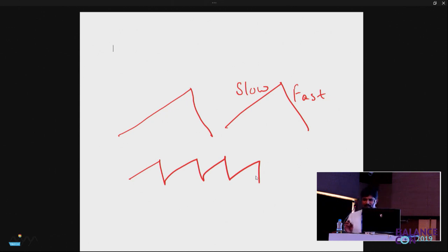For ease purposes, I will only be concentrating on the horizontal direction. Later on, we can build this for the vertical. So this is a typical jerk nystagmus. What is the characteristic feature of a jerk nystagmus? That there is going to be one slow component and then one fast component. Then there are other varieties of these things. In the workbook, there are a lot of other examples. So now we will be able to define.